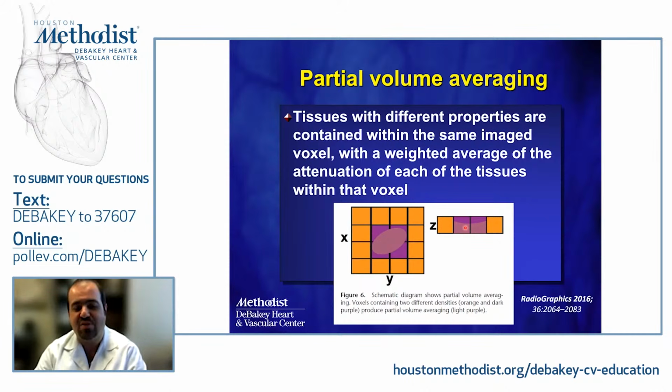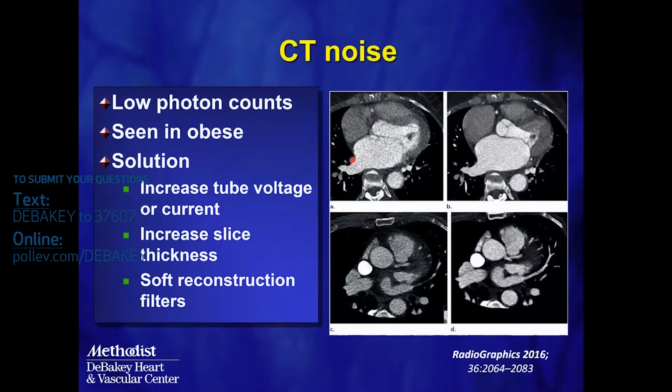And that basically occurs because of the inherent spatial resolution of CT, but at the same time, the blooming density of tissues that have a much higher attenuation than others. So it actually creates this bloom across the region of interest.